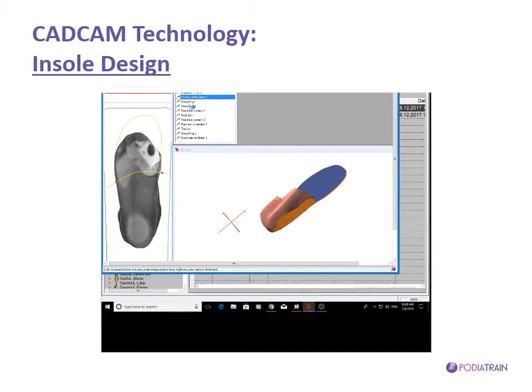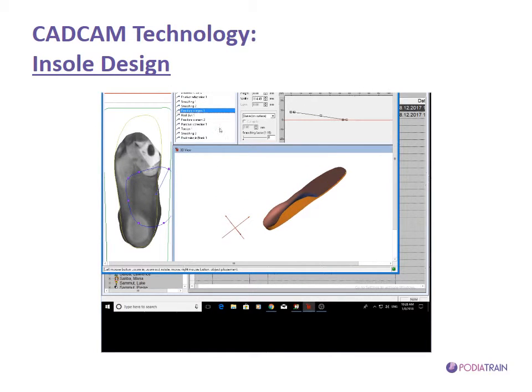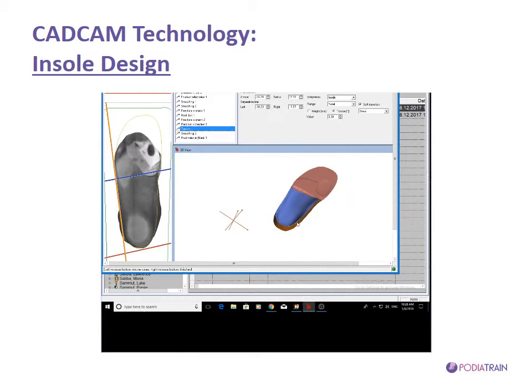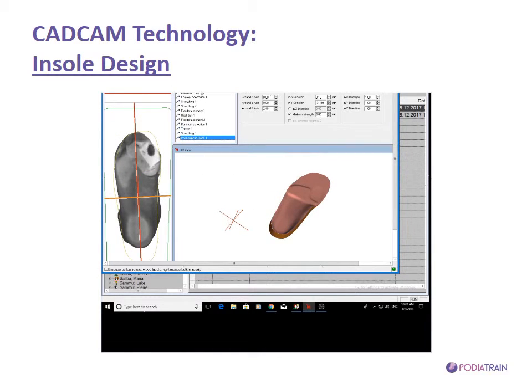And then we smoothed this to have an insole. We produced a medial longitudinal arch and the heel dish around the heel. And then I designed a single winged plantar cover, a punctual correction to offload together. These two will hopefully offload the area of the ulcer. Torsion, we applied a small 3 degrees medial post, smoothed it again, and chose the appropriate blank from which to cut or mill our insole.